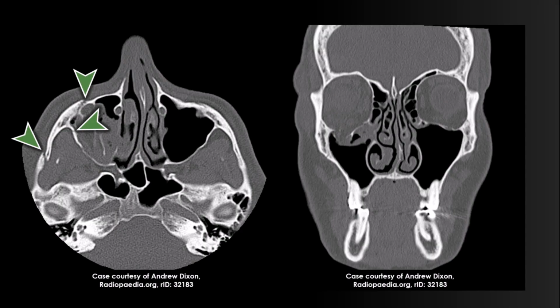This combination of three separate fracture points surrounding the zygomatic bone is why zygomaticomaxillary complex fractures are sometimes called a tripod fracture. There are at least three separate fracture points that dislodge the zygoma from the rest of the face.